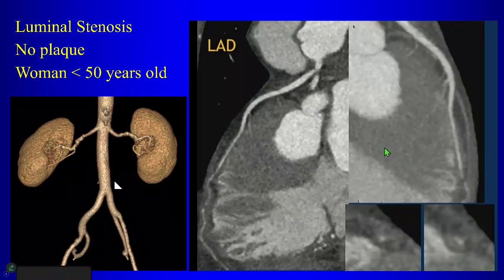So here we're looking at renal arteries, right? What's the finding in the renal arteries? FMD. Yeah, FMD, right. You see these irregular areas of dilatation. So what's the diagnosis for this patient? We're talking about her coronary arteries. What's going on here? Well, the term is not vasculitis. What do we call this? Dissection. Yeah, this is a spontaneous coronary artery dissection, okay?